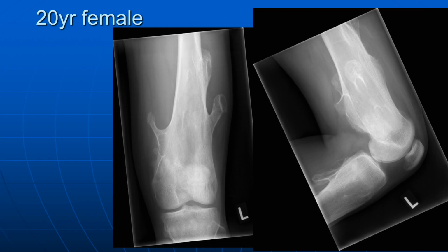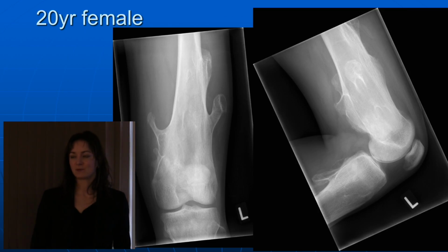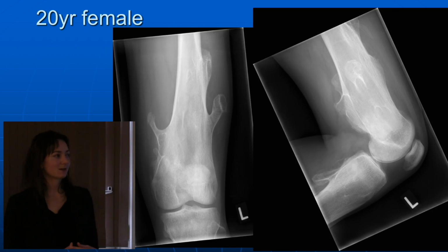These are now spot diagnoses. These are nice. Now we're looking at cartilage lesions. These are lovely. This patient's probably got a syndrome as well. Anyone seen these before? These are really common, yeah. These are osteochondromas. They don't fit into that nice category of bone tumours that we talked about before, but they have their own classification.